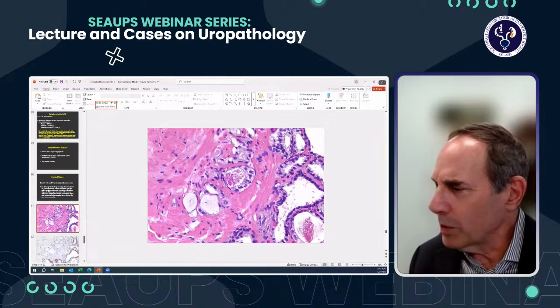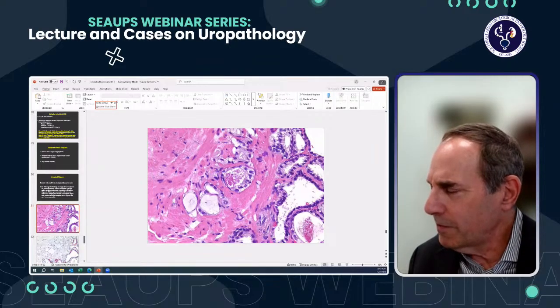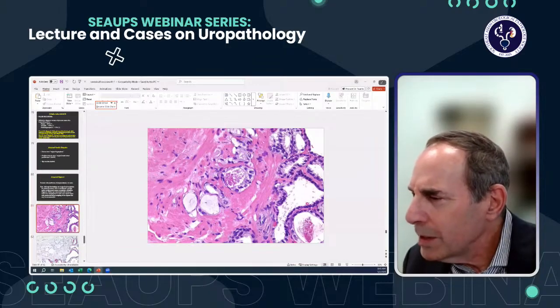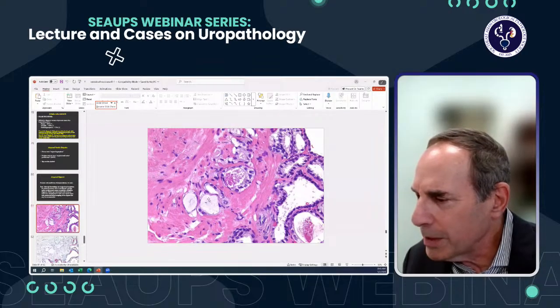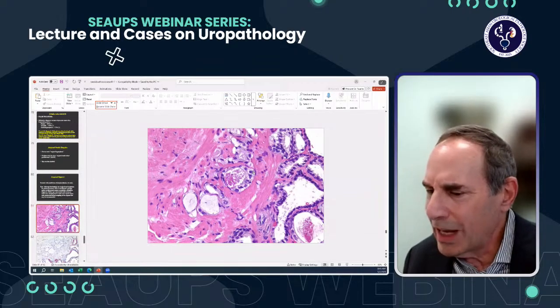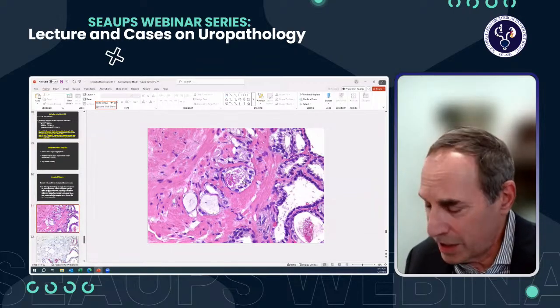So what about this focus? Again, find the glands you know are benign first. So on the lower right is more typical benign glands. Here in the middle, these glands are crowded. There is cytologically really not much atypia. Many of these glands are atrophic. There are some crystalloids, but again, that's not specific for cancer. So on the H&E, I would not feel comfortable calling this cancer.